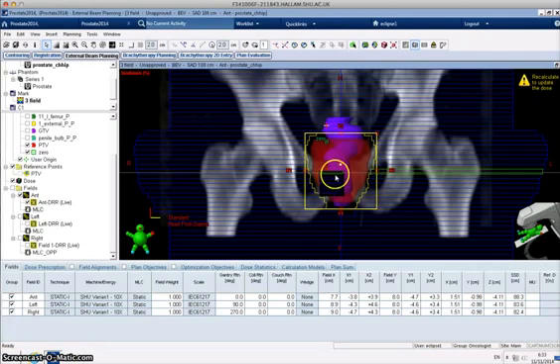You're going to have to just excuse this error here really. I'm doing this on a remote connection, and we've just got a bit of an artifact there on the imaging, so that won't appear on yours.